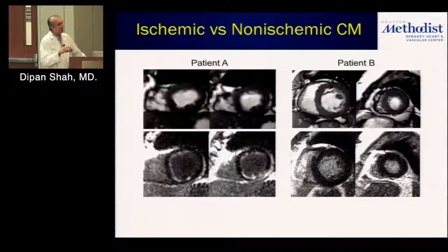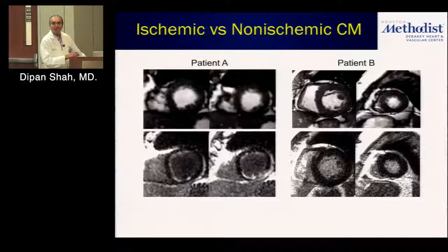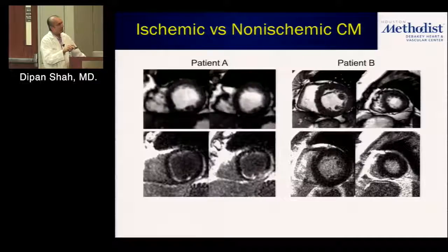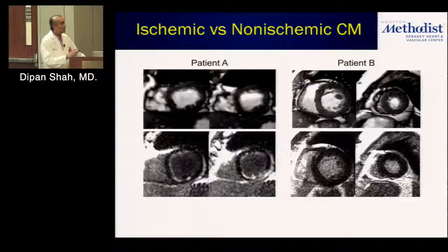Now, if I show you the delayed enhancement findings, how many of you think this person here is ischemic cardiomyopathy? Raise your hand. Okay. How many of you think this person here is ischemic cardiomyopathy? Raise your hand. Okay, that's good. Nobody fell for that trap.